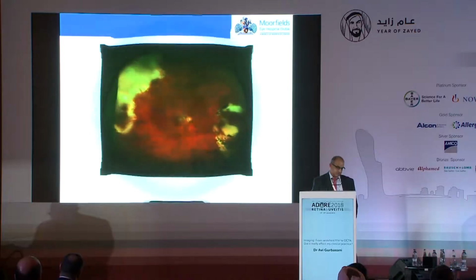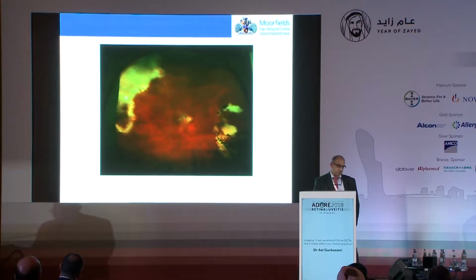And sometimes this is useful when you've had vitreous hemorrhage in diabetes or in other vascular diseases. And so she's not had a vitrectomy, for all the VR surgeons here. This is purely on medical treatment. The vitreous haze cleared up.